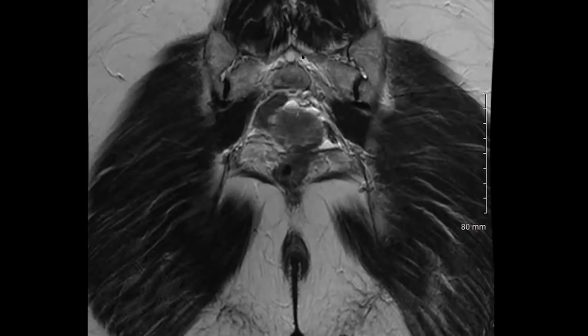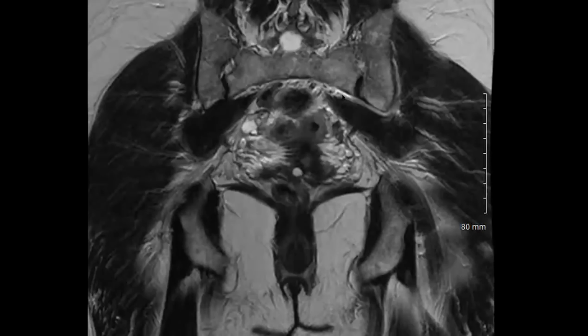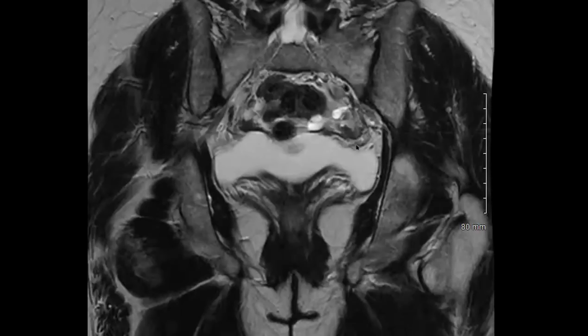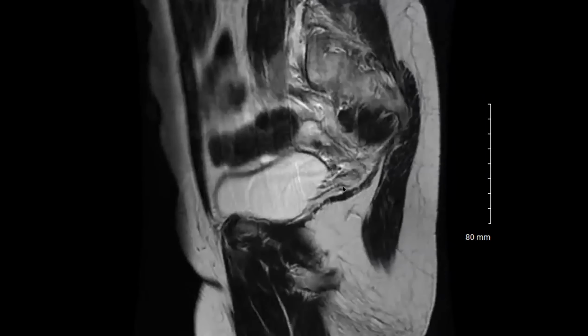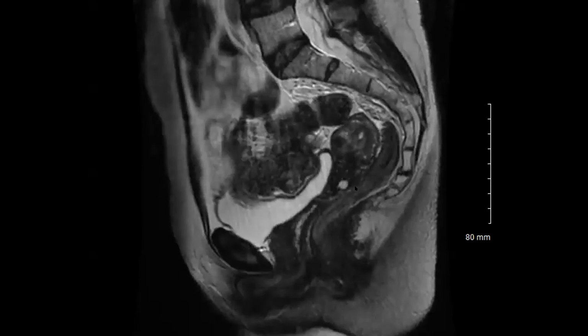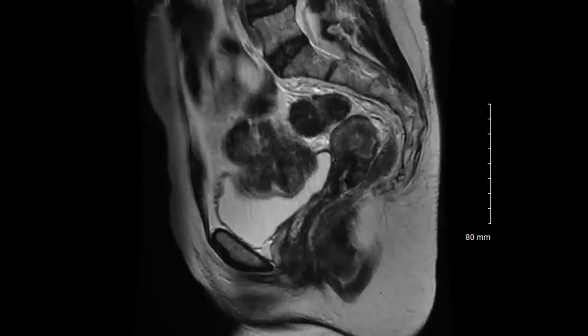Okay. So again, woman with chronic pelvic pain, and there was a CT done a while ago, which was non-conclusive, with continued chronic pelvic pain. So we got this MR, and let me start with the typical sagittal T2-weighted images. There was a cyst in one of the ovaries, and I was scrolling through the pelvic MR. I noticed the fibroids, Nabothian cyst in the cervix.